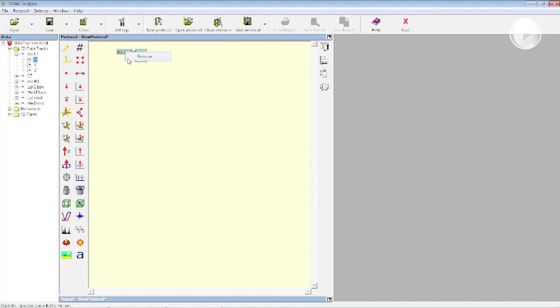So did you see that if the input is the correct one, the dot is going to be red and not gray as it was before.